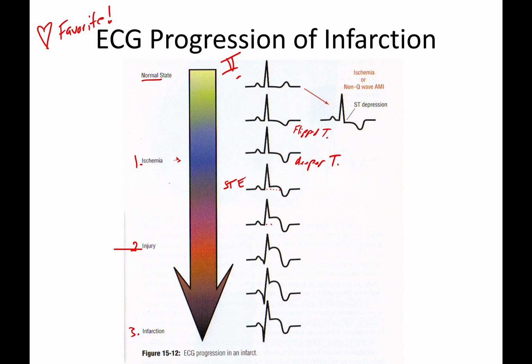That elevation is going to continue to progressively get higher as things get worse. And you can see now we're in the full injury zone. When we start moving from injury to infarction, you'll see your Q wave begin to develop.